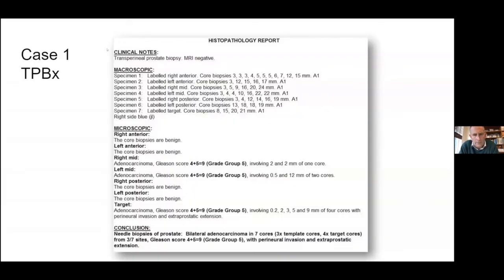When we do biopsies, it's a routine template biopsy, transperineally. Despite the negative MRI report, and we'll come back to the MRI in a moment, I did do some targeted cores, not where you were saying, Mark, but actually posteriorly in the midline. This is what the biopsy showed.